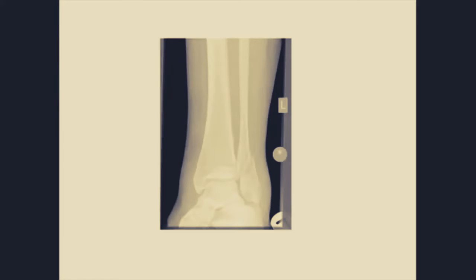Here's another fracture. So after describing the things we've already talked about, such as the demographics, this is an example of a femoral shaft fracture, which is affecting the proximal third of the femur, and it looks like it's spiral in nature, but it's simple, not comminuted. To further comment on any displacement, we need to see a lateral view. Here we can see a radiograph of the patient's left fibula, or ankle joint. We'd obviously want to comment on the demographics. It's in the distal third of the fibula, probably oblique in nature. However, we can't comment on the displacement because we haven't got a lateral view.